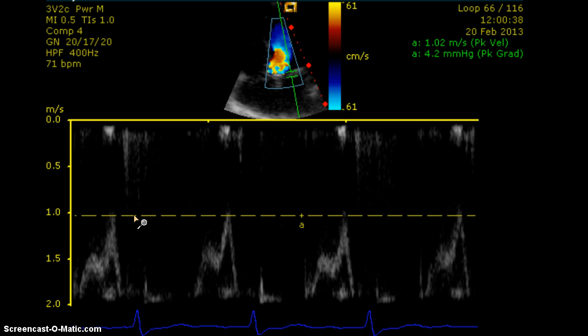Also of interest to note, with this equipment, this is one of those machines that force you to drop your horizontal line first and then to place your crosshair. And we can see that this user dropped the horizontal line but did not reposition the crosshair to what they were actually measuring. So you just have a caliper floating in the screen. It's very unclear as to specifically what's being measured. So the corrective action would be to move the crosshair to show exactly what you're measuring.